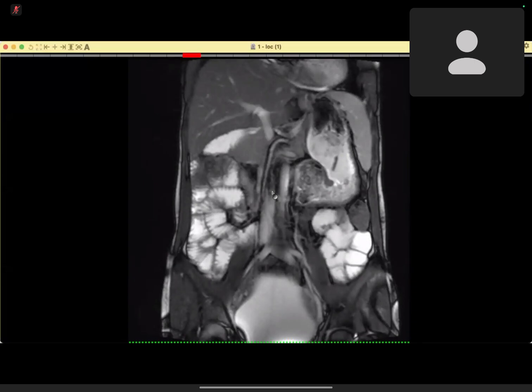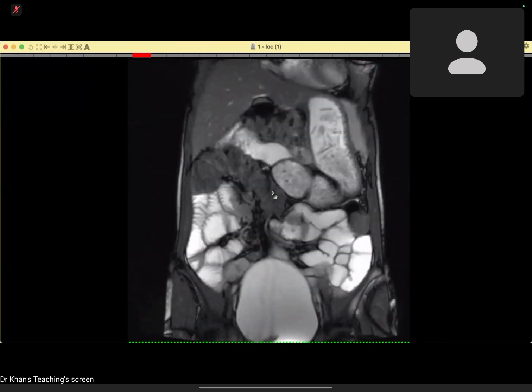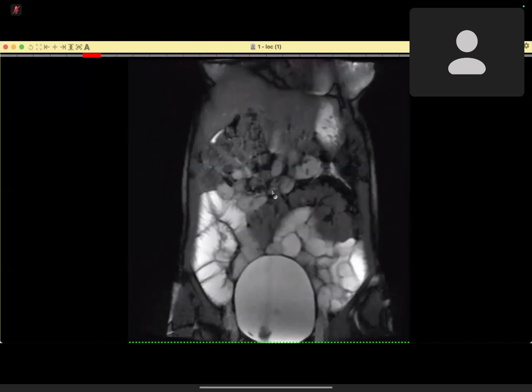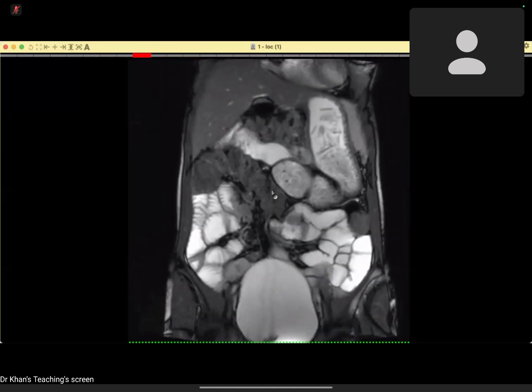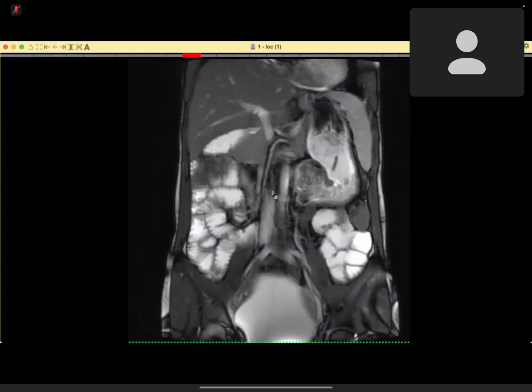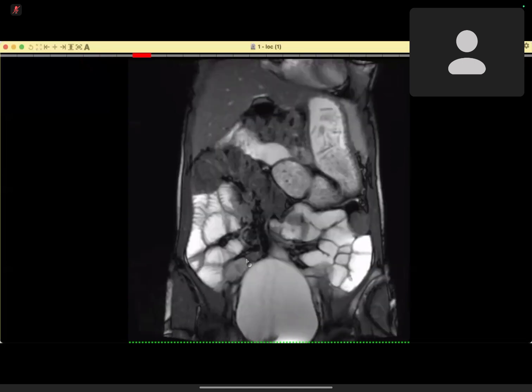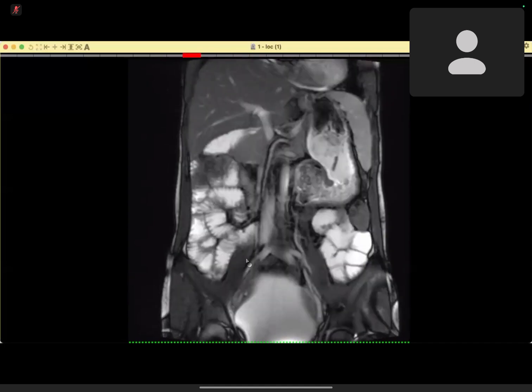All of the jejunum is seen on the right side of the image, and showed the normal valvulae conniventes, and also I can see that the ileum is clustered on the left side, which shows fewer valvulae conniventes. So this rules out celiac disease, because I can see that there is no reversal of pattern between the jejunum and the ileum.